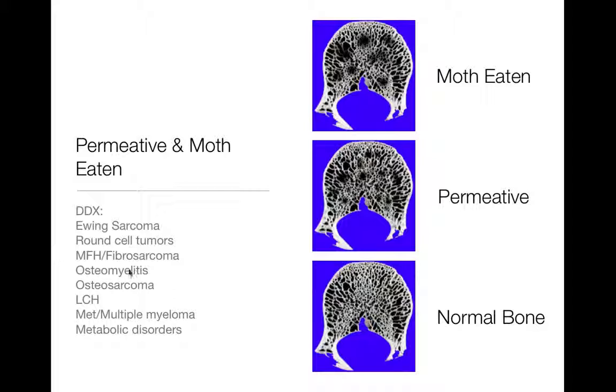And some more of the sarcomas that don't infiltrate the bone can look scary as well. All these things are scary, so nothing benign on here.